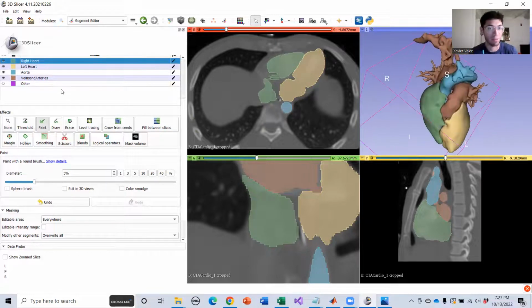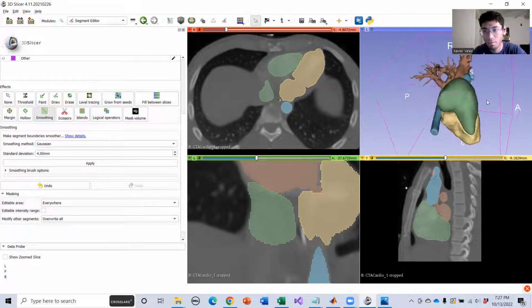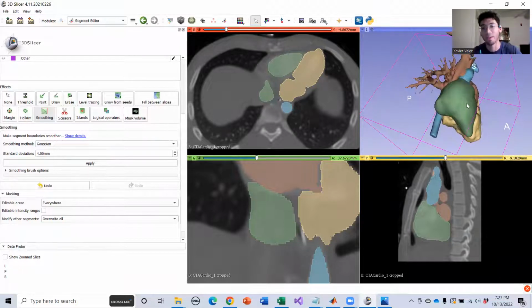You know, there's not much more. Maybe if we wanted to, we could make this a little crazier, and we can go ahead and do that. But really what we want now is to export this, right?